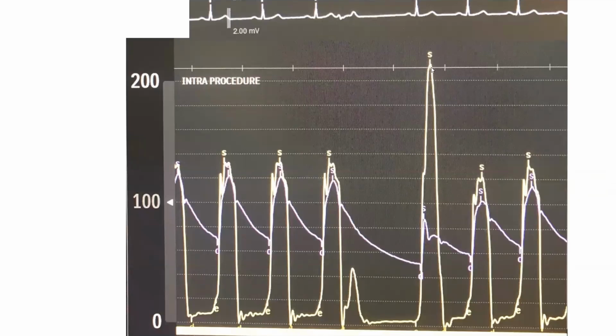Post-PVC rise in gradient, but very importantly, drop in aortic pulse pressure. Okay, so it's not just a rising gradient. You get after a PVC a rising gradient with aortic stenosis as well, because you have increased the flow after a pause. But the difference in aortic stenosis is that both aortic pressure and LV go up and the gradient goes up. But in dynamic LVOT obstruction, when you have a post-PVC contraction, you have increased contractility. Therefore, you have increased obstruction.